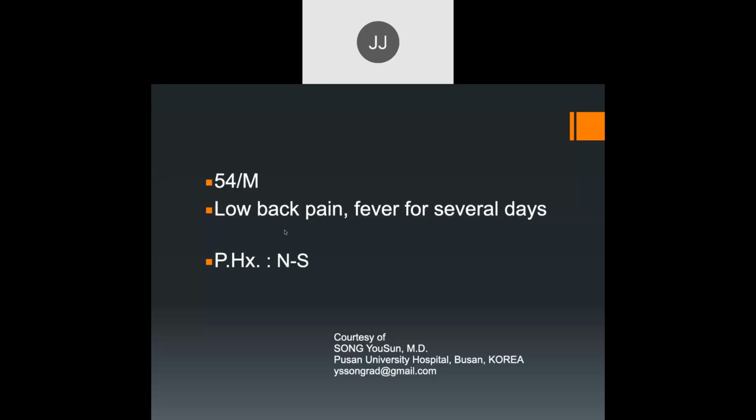I like the word disc infection. Yeah, I think that's better too. Because you could have a lot of inflammation, but almost always a discitis means disc infection. But you're right, it could potentially be other things that could cause inflammation. I think discitis kind of just means inflammation.